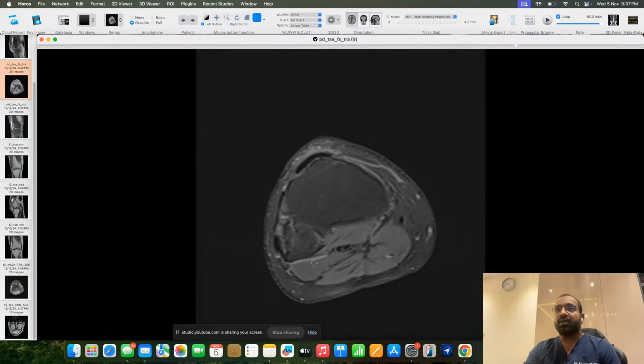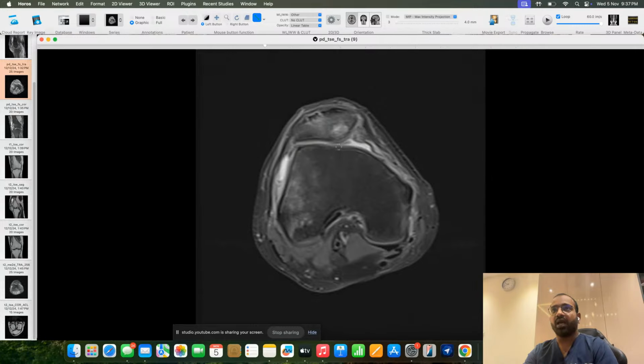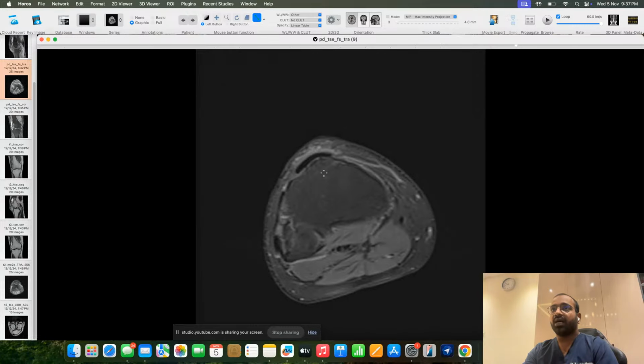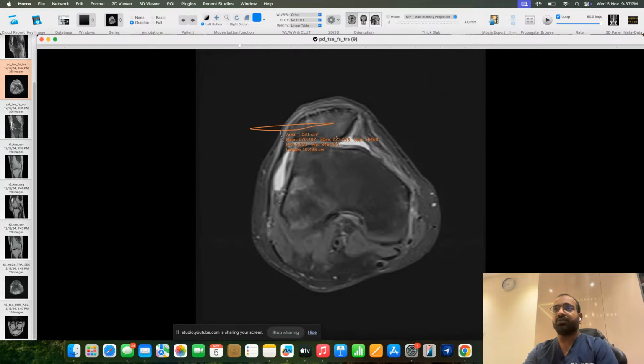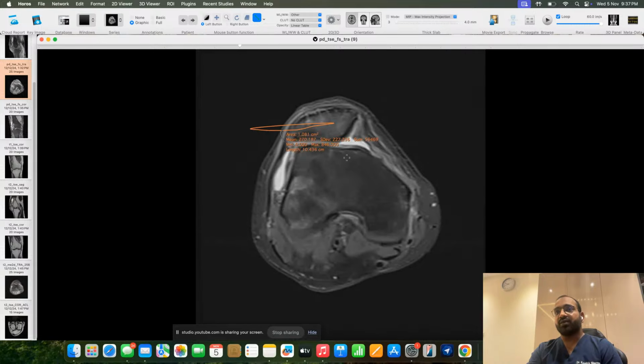If there is more distance between the trochlear groove and the tibial tuberosity, the patellar tracking will be abnormal. So there is every chance that the patella can dislocate. What are the chances of patellar dislocation in this case?